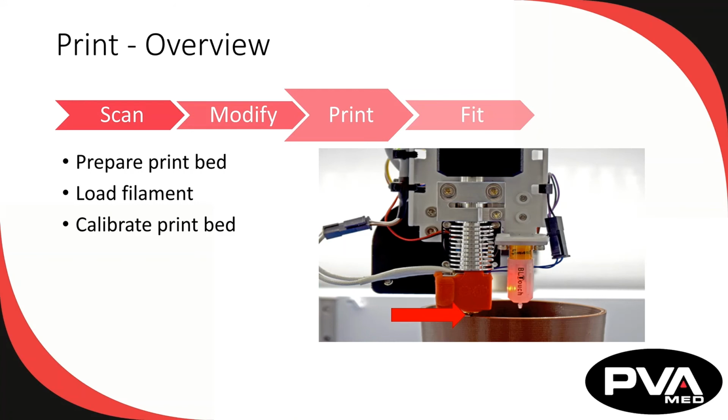Bed leveling is also very important. Like calibration, bed leveling is generally performed once and need not be reperformed unless or until a printing problem is encountered. Advanced printer features include programmatic bed calibration and automatic bed leveling, and these are enabled by a probe and a programmatic bed compensation program run by the controller.